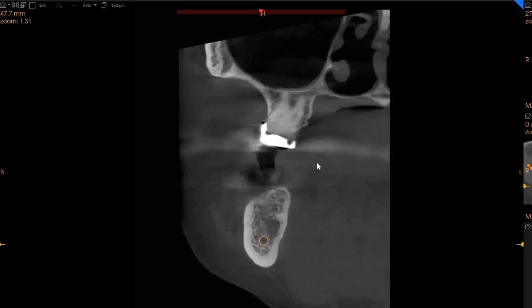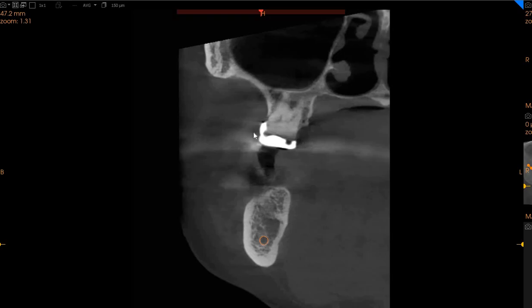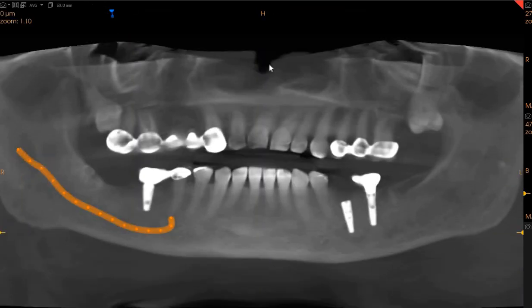This is the upper right 7, with no periapical radiolucency or crown problems seen. No fractures or radiolucencies can be observed either. This could be the pain that the patient is commenting about, and could be periodontal in nature. Clinical evaluation will be needed.